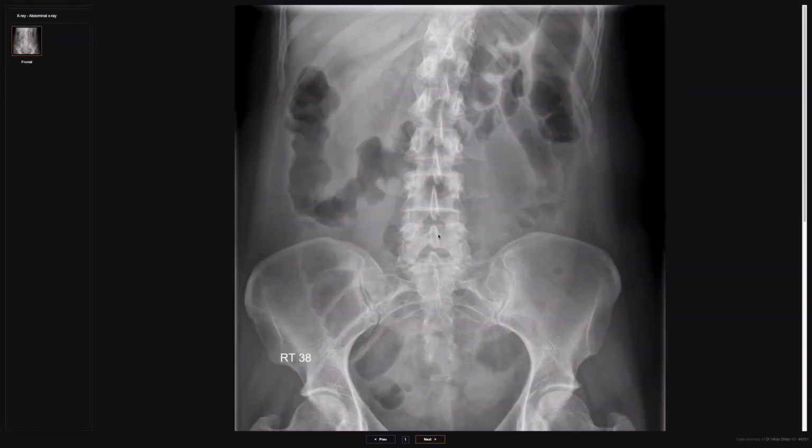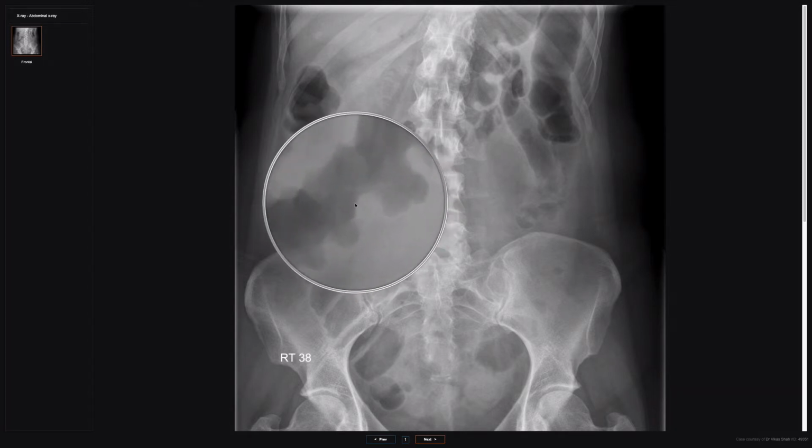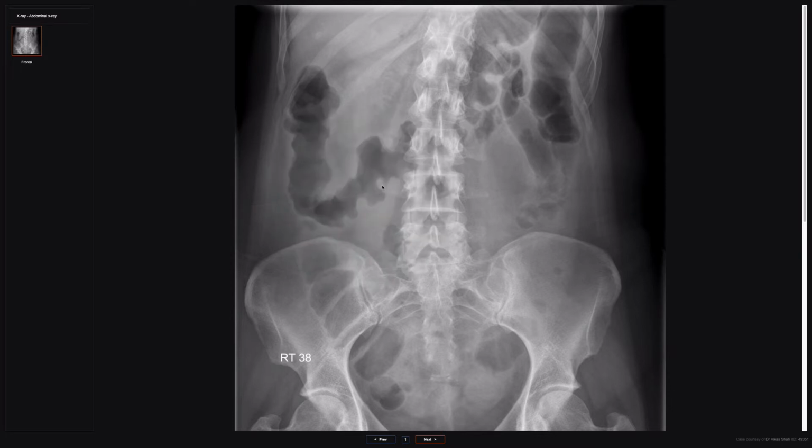All right. So the next thing with B for bowel is the bowel wall. So in A section, we talked about air in the bowel wall. In this section, I want you to think about thickening of the bowel wall. And really, we're focusing more on the large bowel than the small bowel when it comes to thickening. And with the large bowel, the kind of pattern we get is something called thumbprinting. So thumbprinting is what you see here, which is the bowel wall, the haustral folds are very thickened, and it looks like someone's come and put a thumb on the edge of the film, and that's the kind of picture you get. And we see that in a couple of different places.